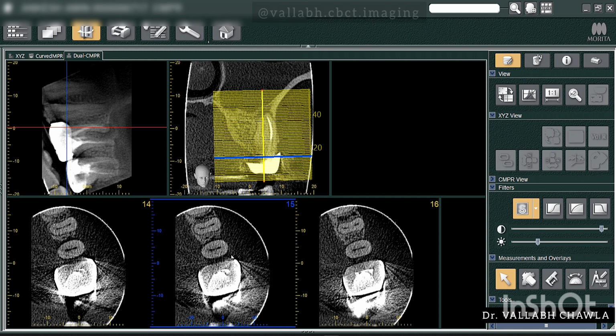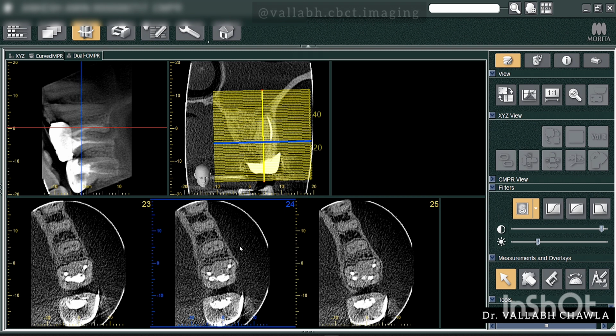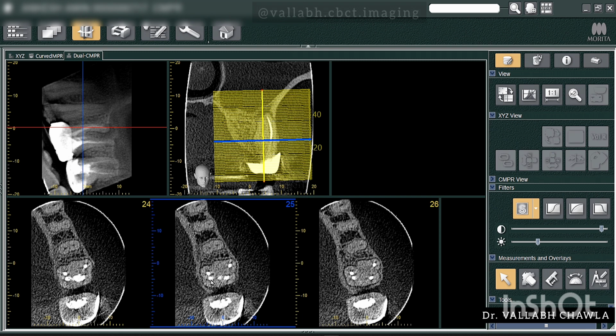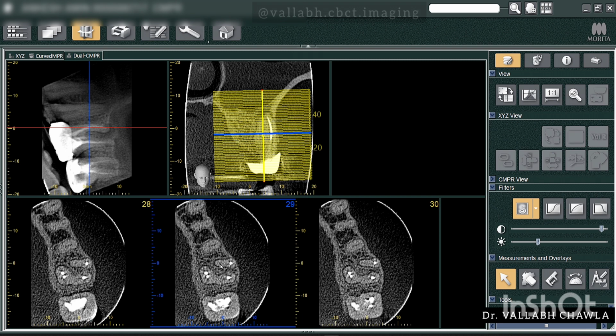Okay, so this is the occlusal aspect going towards the root region. There's the crestal alveolar ridge. Now going more apically, you can see the orifice region. This is the mesiobuccal, there's the distobuccal, and there's the palatal. Going down, there's mesiobuccal 1, and a small evidence of mesiobuccal 2. Okay, MB2 root canal. You can just mention it.